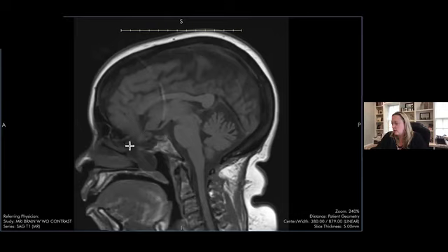And again, you can see this soft tissue that's tethered and inferiorly displaced on both of these, with also CSF signal soft tissue extending into the sphenoids and posterior ethmoids. So this is a very unusual case, but it is a case that is compatible with bilateral large meningoencephalocele with adjacent traction gliosis of the brain parenchyma. Some of these, when they're long-standing, can calcify. So not something that you would want to blow off as just routine run-of-the-mill sinonasal polyposis.